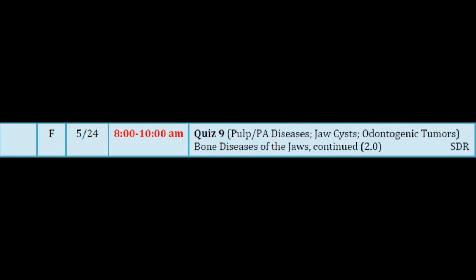So I brought some examples. And what phase would this be? So what do you see? Pure radiolucencies at the apices of 4 incisors. When we look at the crowns of the teeth, it looks like they might have reasons for periapical lesions of inflammatory origin. One of them's had a root canal and had an all-ceramic crown that doesn't show up on the radiograph.